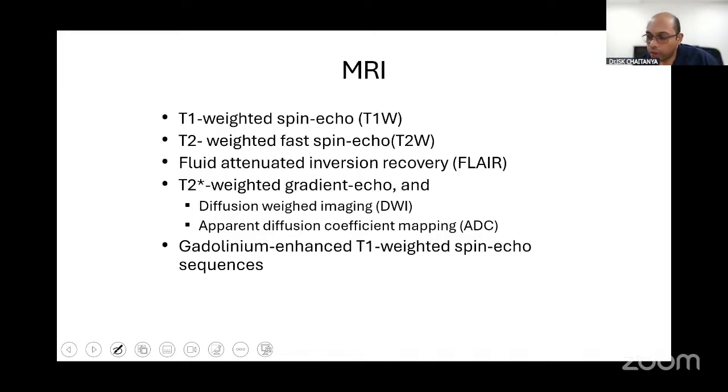So last week we had a discussion on CT, and I've just gone through how to look at the anatomy, what structures are there, and how we identify those structures. From a clinical pharmacist's point of view, I'd like to say MRI has been gaining popularity over the last decade because in management of acute stroke, as we say, time is brain, and the treatment modalities depend on the time of onset of stroke. So we need to see what we are achieving.